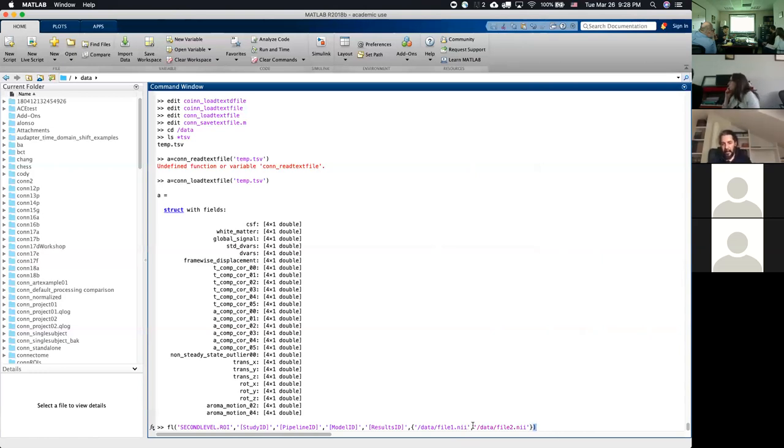This is already in there. It will extract any one or multiple ROIs that we're defining here, in addition to any one or multiple ROIs that we're defining there, and it will use the combination of all of those ROIs for running the ROI level analysis. Is that okay?